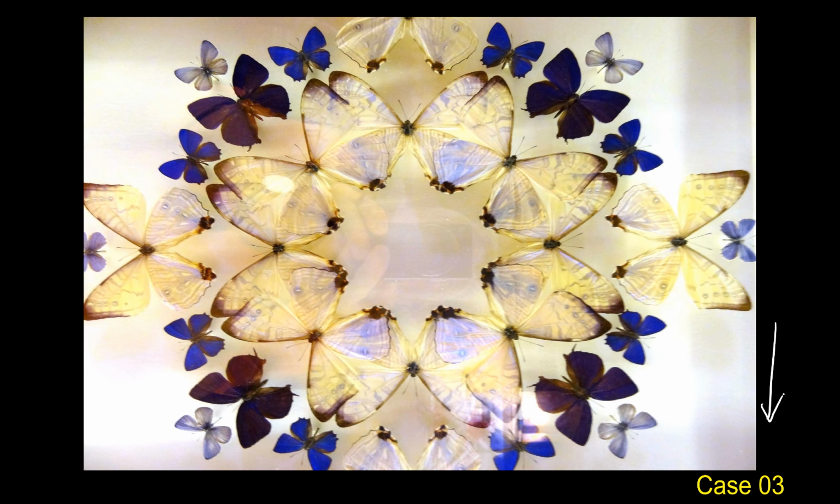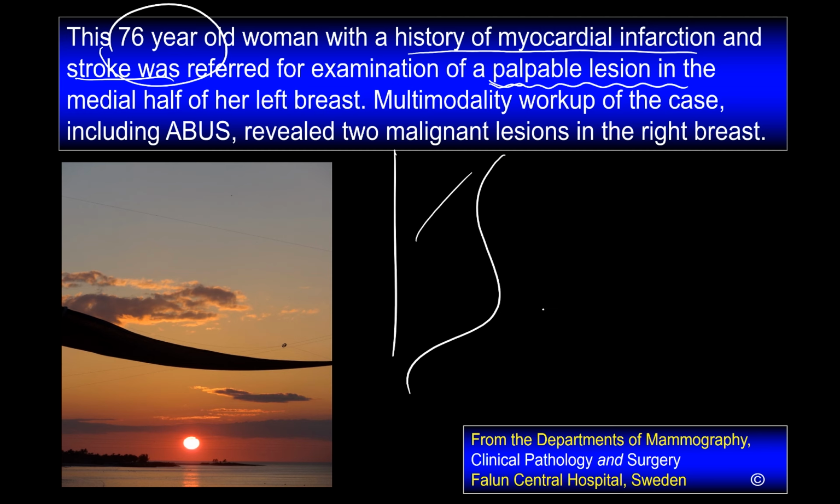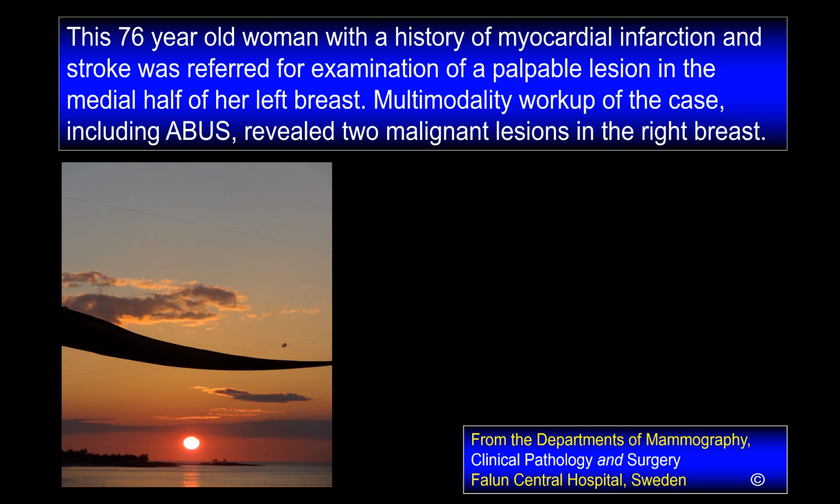Case 3. This is a 76-year-old woman with a history of cardiovascular events, stroke among them. She herself and her referring physician felt a palpable lesion in the medial half of her left breast. Let's look at the multimodality workup result.